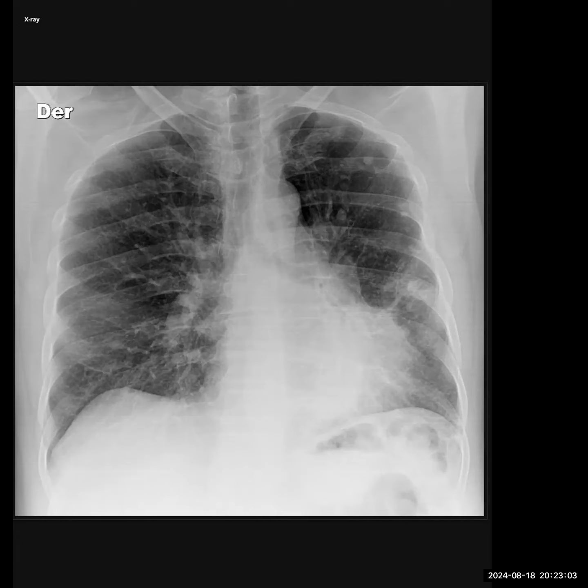In this patient who has a history of cough and hemoptysis, I can also see some tubular branching structures within the upper lobes of bilateral lungs. These could probably represent bronchiectasis with some peribronchial thickening. So I'm concerned that this could be an interstitial lung disease since the bilateral lobes are involved, predominantly the lower lobes as well.